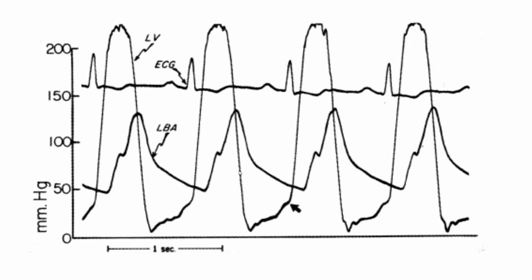You have another feature of AI that you don't always have. You have it more in acute AI: no dicrotic notch on a properly damped tracing. This is a properly damped tracing. You see anacrotic notch, yet you see no dicrotic notch. It's not always the case.